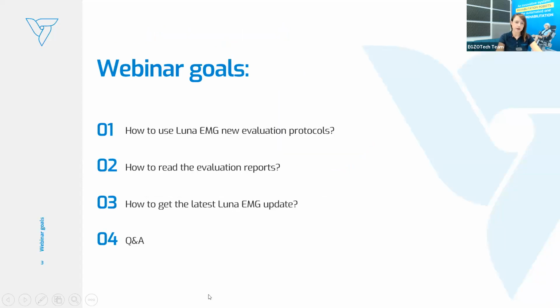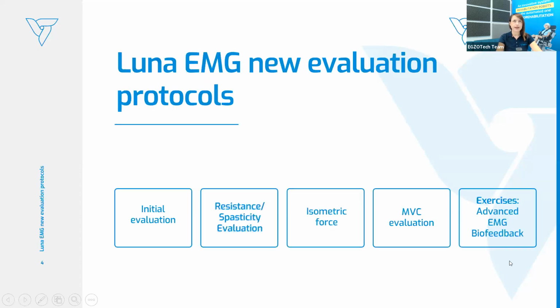Today's goal of the webinar is to show you the new evaluation protocols and talk a little bit about the reports and let you know how you can update the devices you have. And at the end, we will have a question and answer session. So with the latest update in the software, all the customers and all the distributors received new exercises, which are called advanced EMG biofeedback, and we will talk about that at the very end as well.